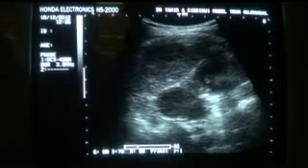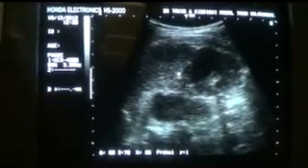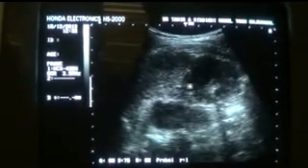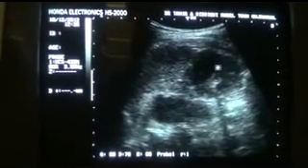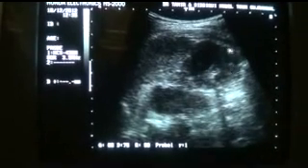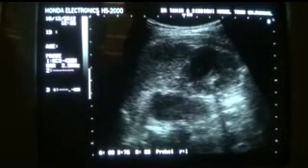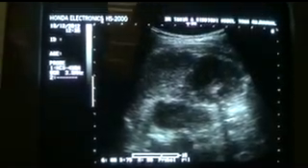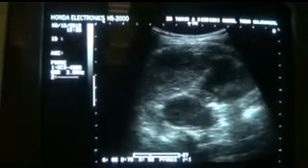whereas there is no doubt about this area, this focal lesion that is cystic with echoes and internal calcification, being an area of abscess within the focal pyelonephritis. It's an area of focal pyelonephritis, and it's very complex.